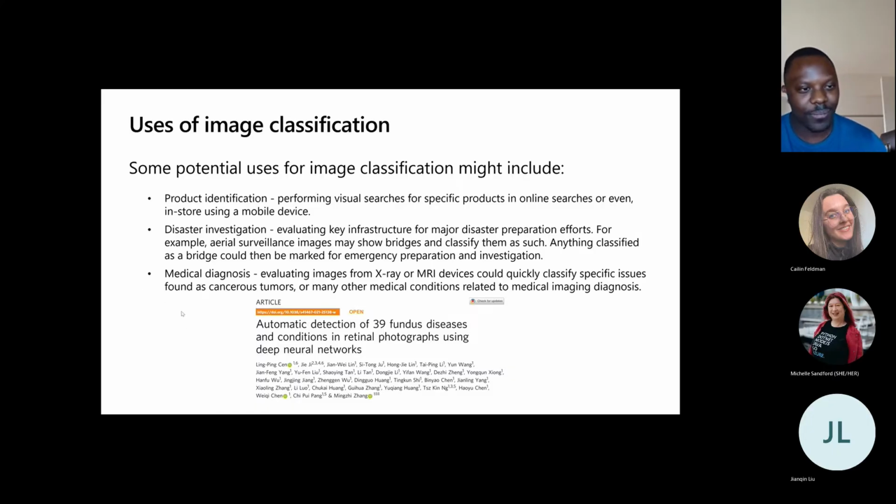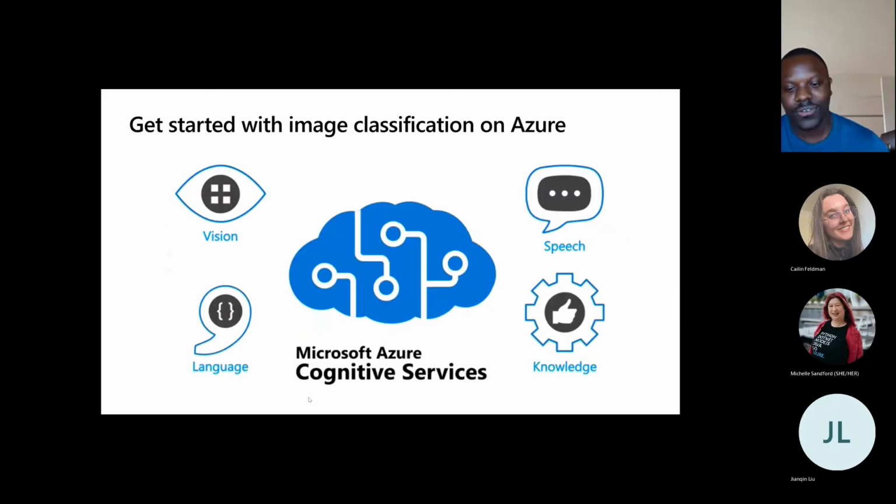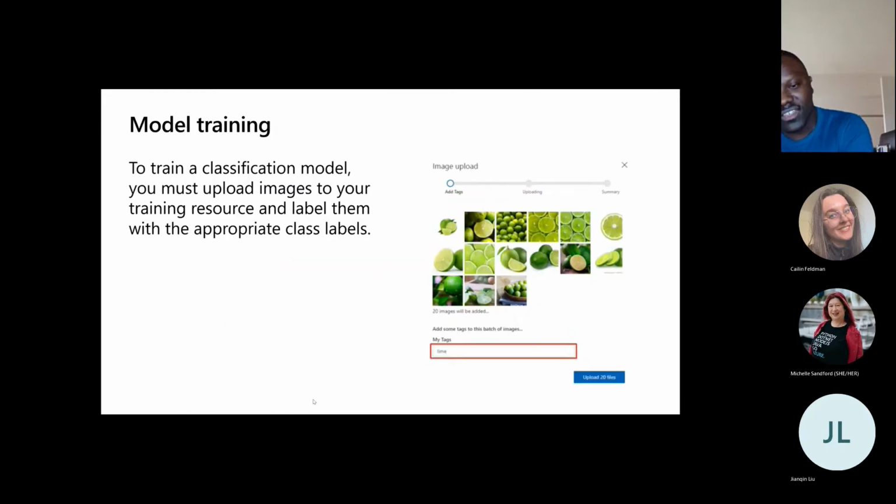So that's just a background on image classification. We're going to use Microsoft Azure Cognitive Services, and they fall into 4 branches: vision, speech, language, and knowledge. For our focus, we are going to delve into Custom Vision. Under the Custom Vision side of Azure, it's been simplified, because what we essentially need to do, and we access this through the portal, is just upload our images.